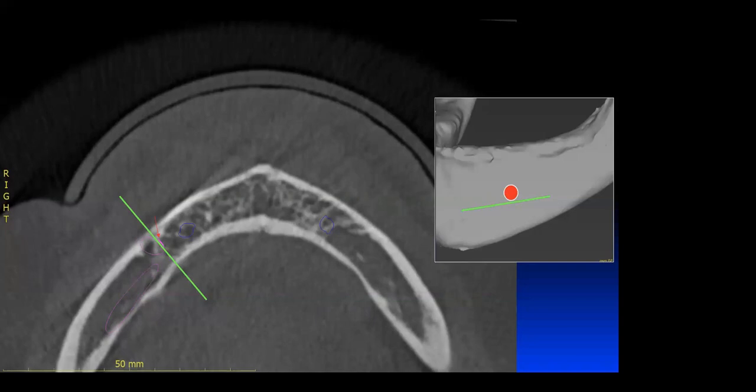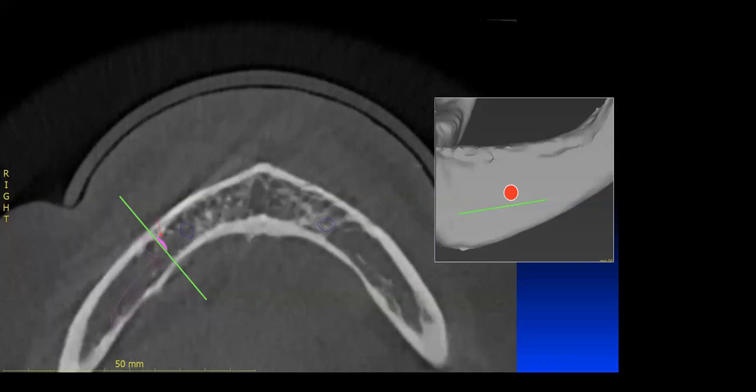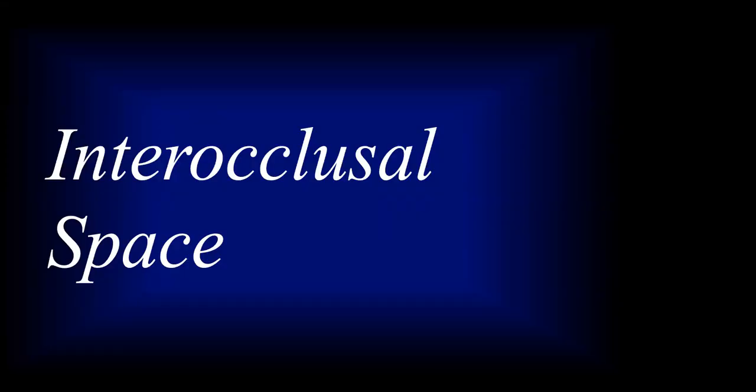So this part of the nerve that is anterior to the mesial or the anterior aspect of the mental foramen is in pink. Okay, and again, I have that well documented in the book to read. That's a little bit complicated, but that is definitely the best way to determine an anterior loop.